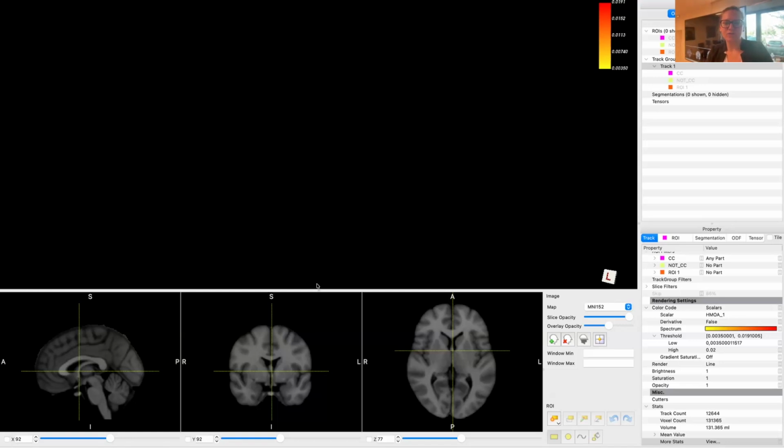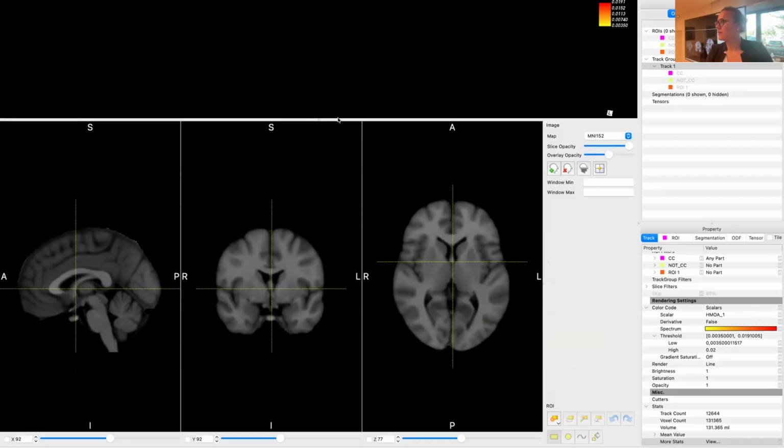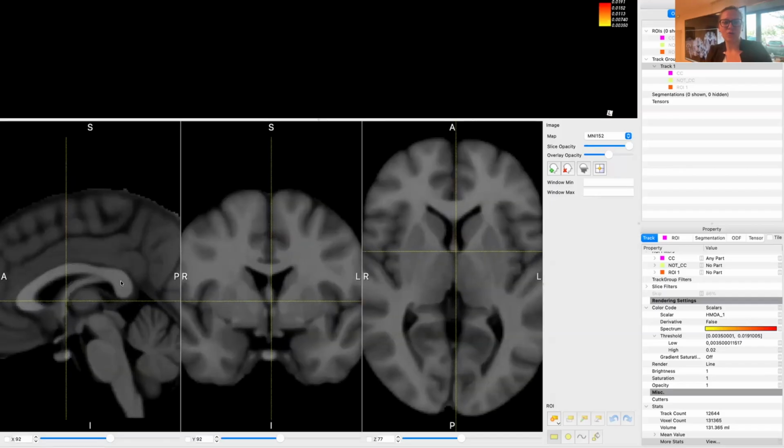Right, are we ready for the language network? Okay. So how would you start? Like language areas, I guess. Language areas. How do you define language areas? And take an atlas, imagine. You can take an atlas, yeah. If you had to take a wild guess now, which parts of the brain would you include?